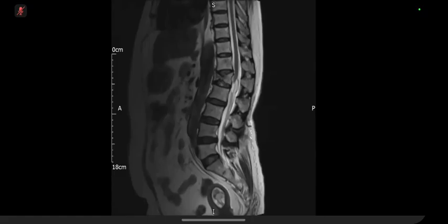So the cord lesion is high T1, quite homogeneous signal. Can I give you a hint? It's an incidental finding in the cord. So yeah, I thought it was a lipoma, essentially. Lipoma, here you are.